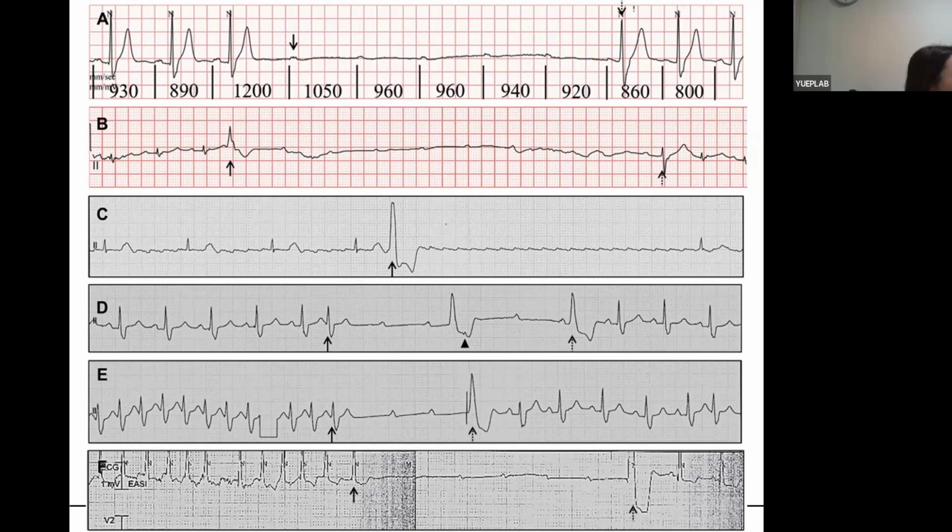I'm talking about the mechanism. So it could be the PVC puts the AV node in the refractory period to make a single beat block. So I think that is different from paroxysmal phase 4 AV block. Actually, it is rather a match to concealment.